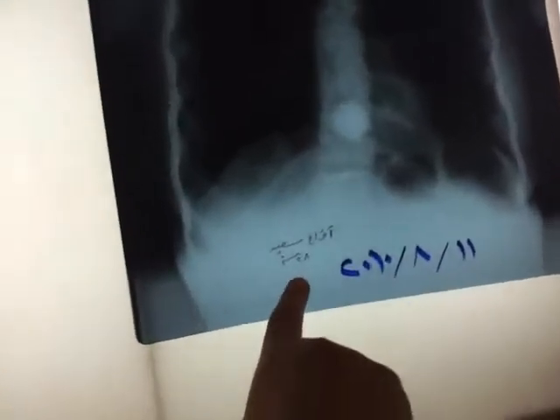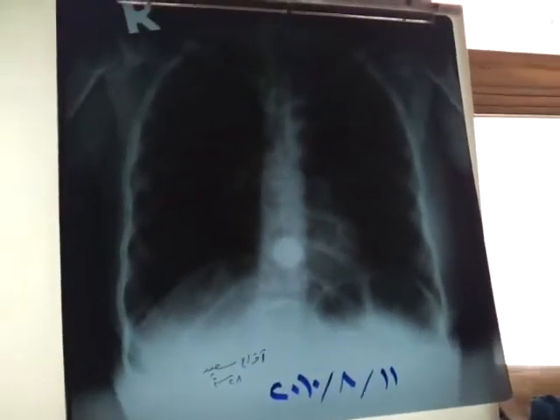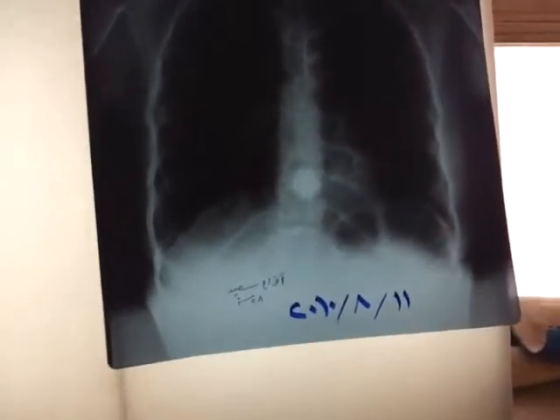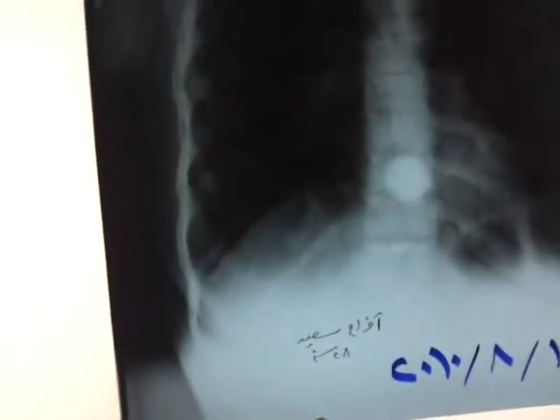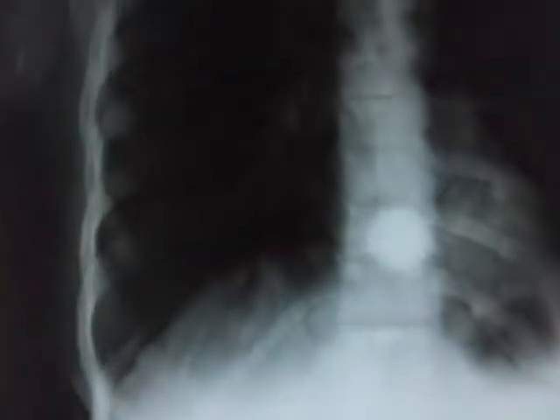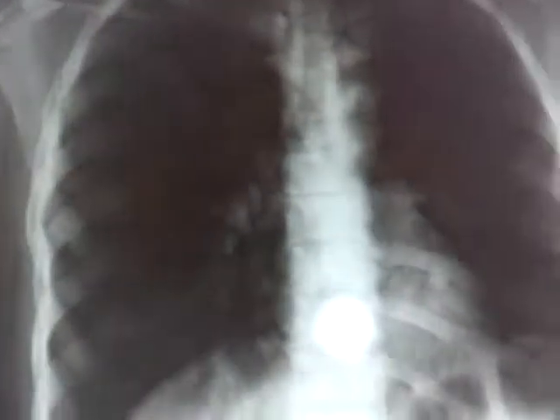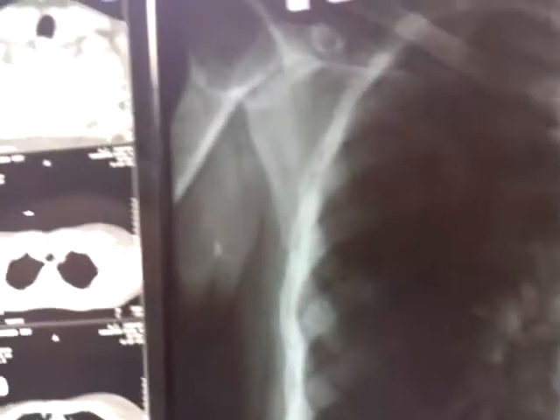This patient is a 28 female. She is very tired, with weight loss, shortness of breath, dry cough, and sometimes hemoptysis. And this is her chest X-ray actually. The X-ray is dark, and because it is dark, it is not showing anything actually.